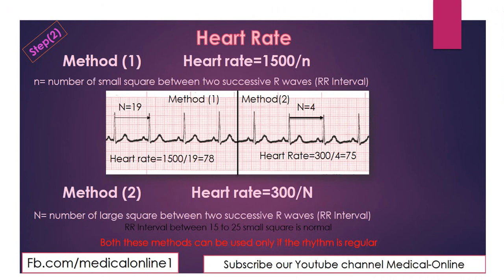Now coming to the second step, that is calculating the heart rate. In step 2, if the heart rhythm is regular, you can apply both of these methods I have given you. In the first method, heart rate is equal to 1500 divided by n, small n.